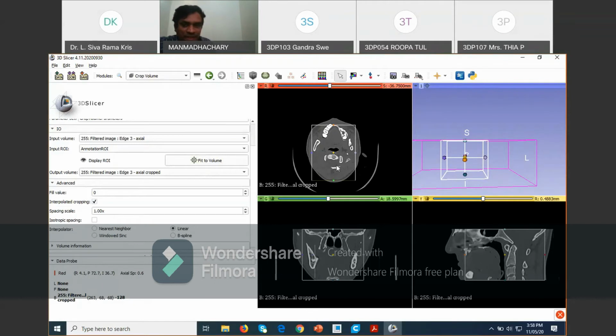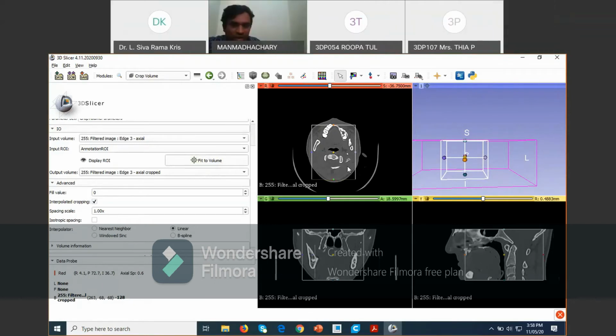Okay. Means I initially cropped it, sir. Again I have to crop it? Not necessary, not necessary. Once is enough. Okay, then, sir, it's okay. The images came. Yes, image came, no?